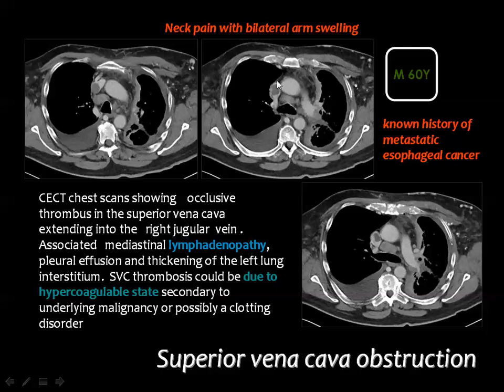This thrombus is not a malignant one because it does not enhance, it does not expand in the vena cava, and the thrombosis here could be due to the hypercoagulable state, which may be present in patients having malignancies.